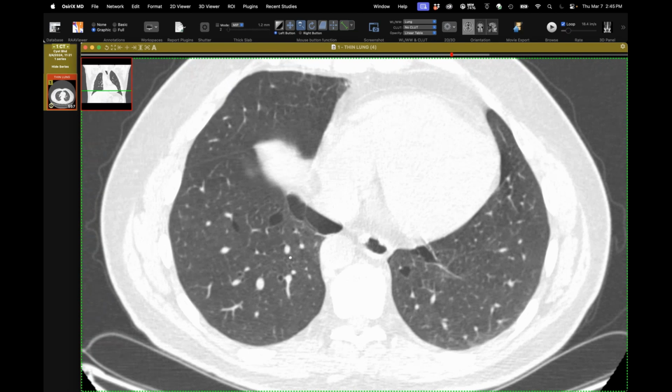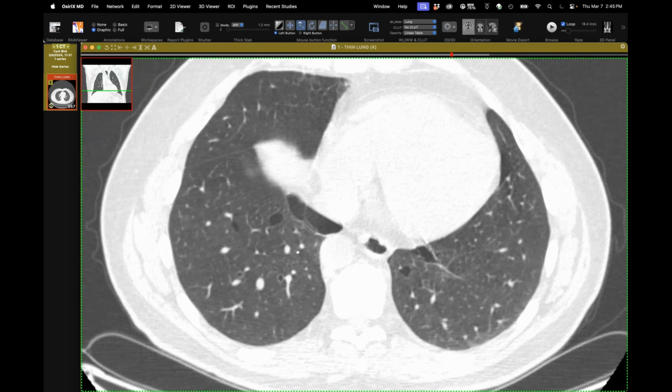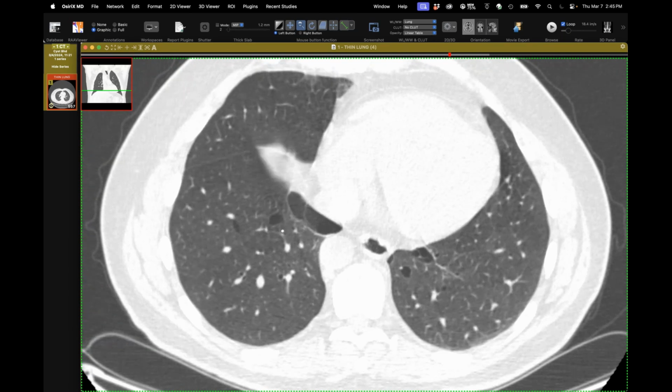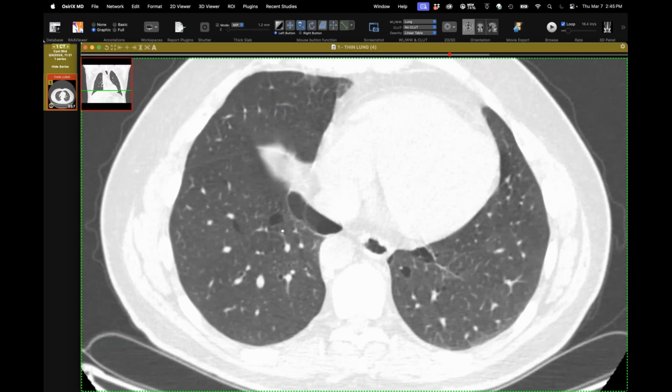And I can't remember where the term floppy cyst came from. I've always liked it. I think I read an article years ago that described them. But I always like these stretched out cysts. They don't look like the cysts you see in Sjogren's disease or amyloid, where they're round, even though they're lower lobe and they often have vessels, they're rounder. And then, of course, the distribution doesn't fit for other things, but they're still very simple looking cysts.